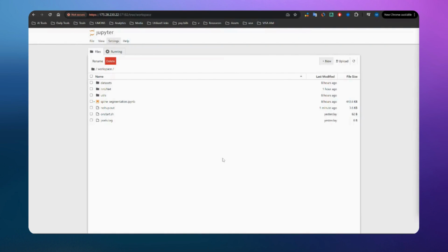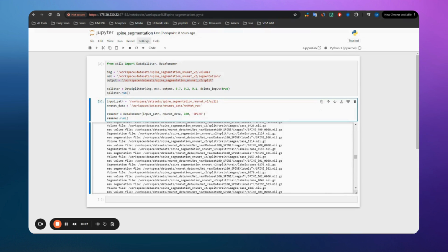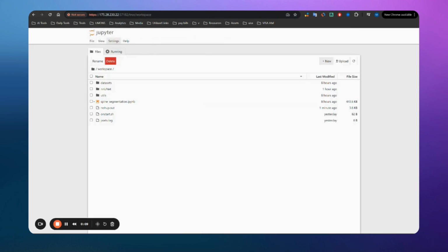Yes, so just one more thing that I wanted to let you know, since the training is still running. If you did use nohup to do your training, or maybe if you didn't, you may lose your terminal. So there are two ways: either tracking your outputs in the nohup.out, but sometimes this file is not up to date. Maybe there are a lot of updates in the training, but you cannot see them.